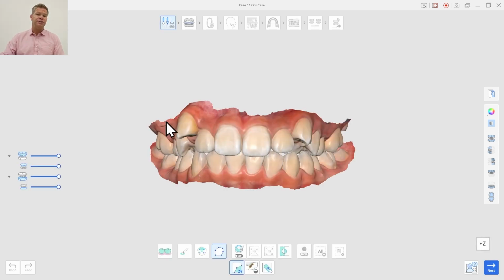The first stage here is to trim the intraoral scan if necessary. Now, if you use the Medit scanner, typically when you're doing the scanning is the appropriate time in which to clean up the scan and make sure you haven't scanned your finger in or have excess data or have extra features that are there. But if you forgot to do it at that stage or need to clean it up, we did add all those tools here for you to do that. Now this one's in good shape, so we'll just move forward here.